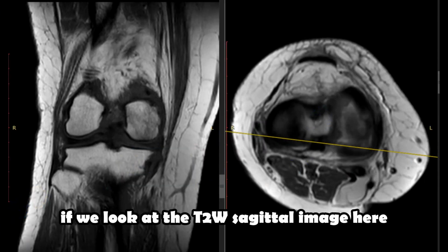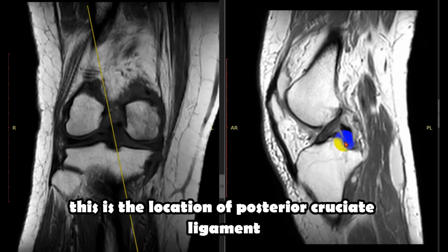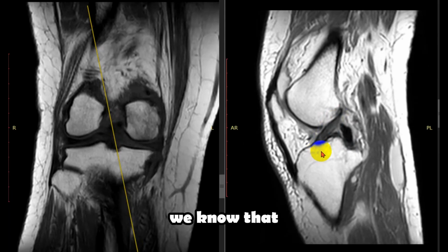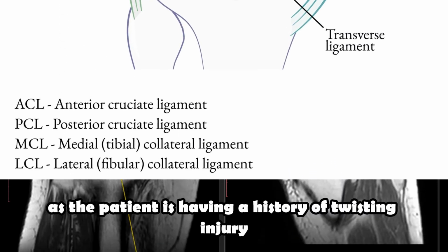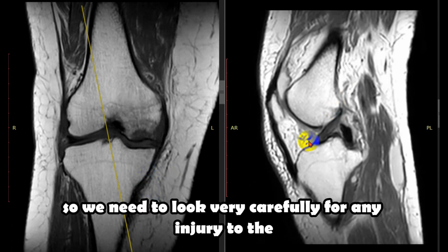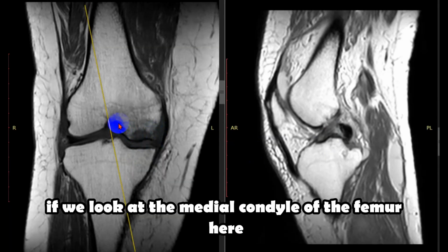If we look at the T2 weighted sagittal image, here we can see this is the location of posterior cruciate ligament and this is the location of anterior cruciate ligament. We know that the anterior and posterior cruciate ligament gives the stabilization of the knee joint. As the patient is having a history of twisting injury, so we need to look very carefully for any injury to these cruciate ligaments.